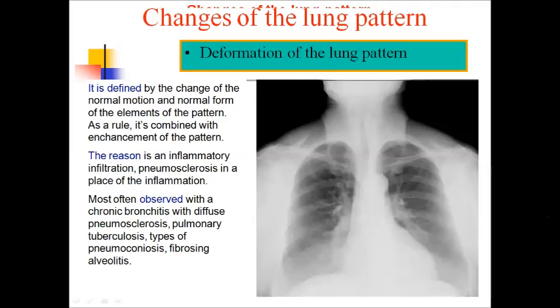And deformation of the lung pattern is defined by the change of normal motion and normal form of the elements of the pattern.